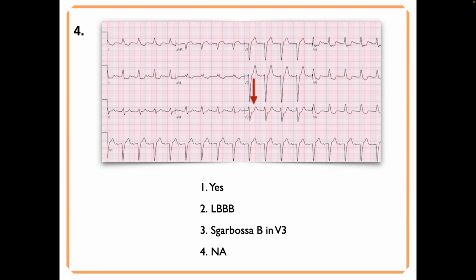If you look at where the J point is and line it up with the J point below, you go, oh wait, that's not ST elevation, it's just part of the QRS. So the take-home lesson is you have to learn that particular RR prime pattern and not be fooled into thinking it's ST elevation.